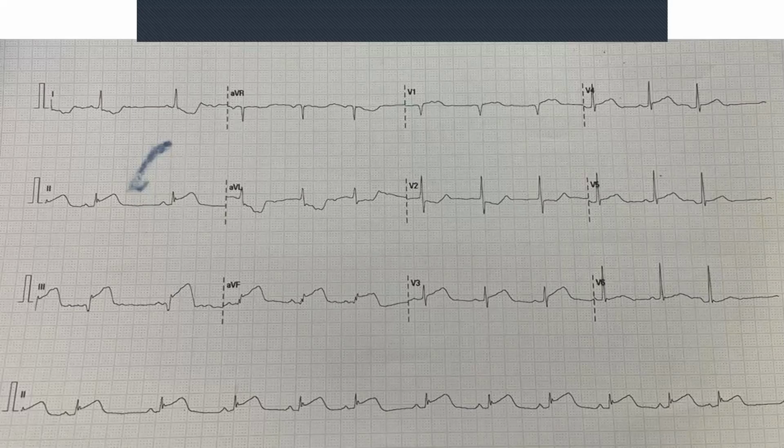That doesn't mean everything is all right. You can have combinations. For example, lead I up and lead aVF up, lead I down, or both down. Those are the only four possibilities. The axis is only normal, left, right, and extreme right. If you're still looking confused, go back and watch the video.